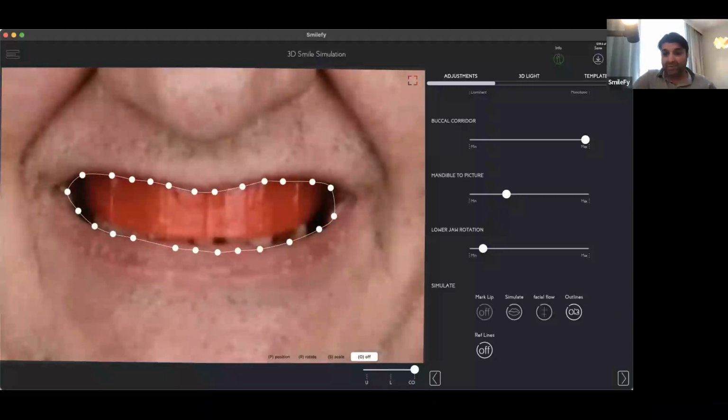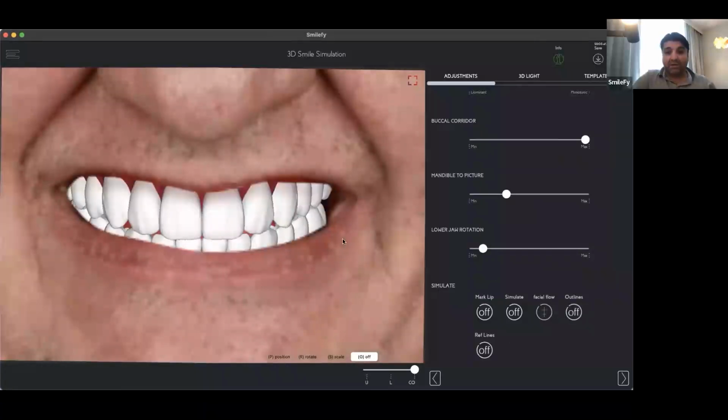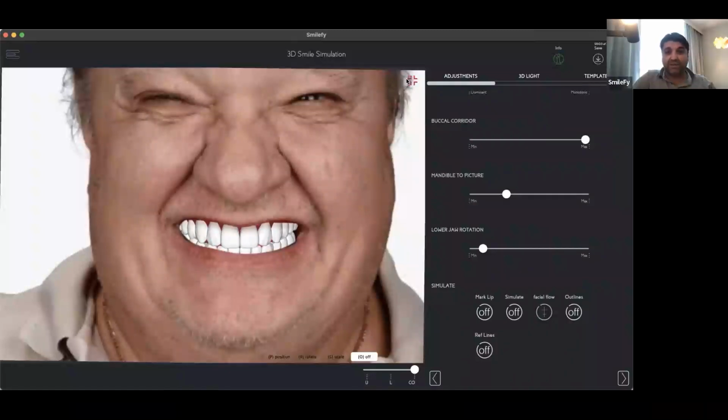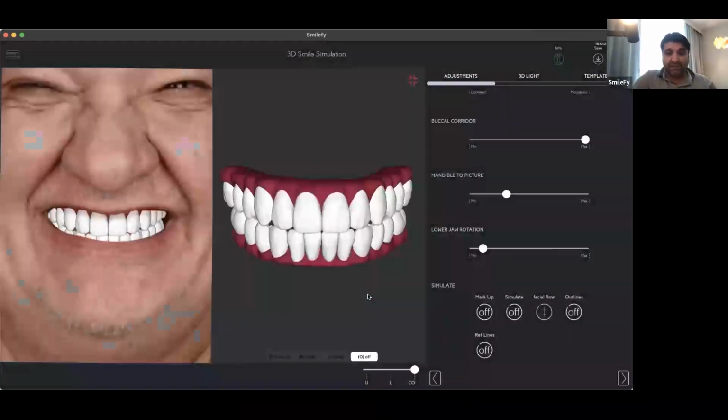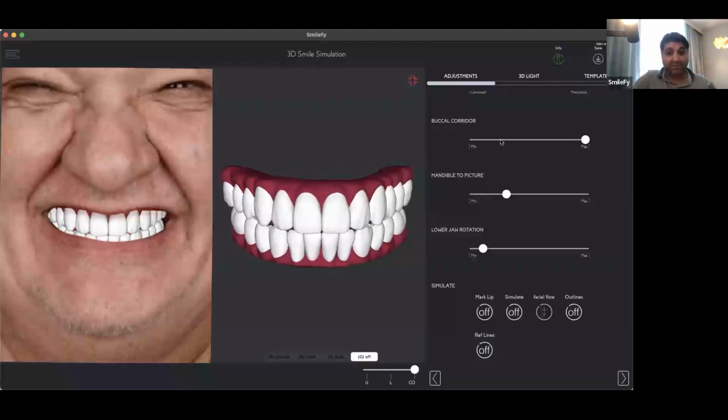What do we have? We have the outlines. We put the outlines in the mouth, and that's the design, the 3D design. That's a 3D object, you see, in the mouth of the patient. Full arch implant bridge or removable dentures.